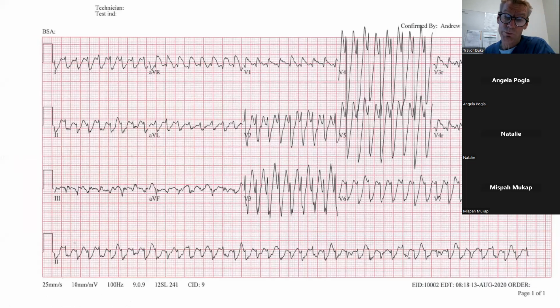Somewhere in the ventricle, there's a pacemaker that's firing off at a rapid rate, and the electrical activity is then flowing around the ventricle in a slow way. It's getting there the fastest way it can, but from a different starting point, not the AV node. And so therefore, this is ventricular tachycardia, okay?